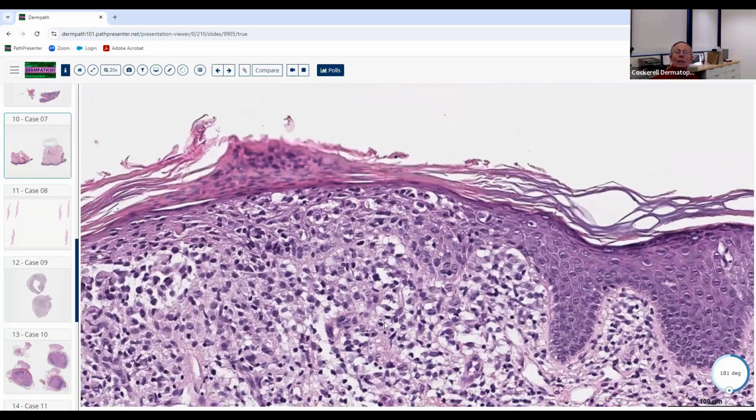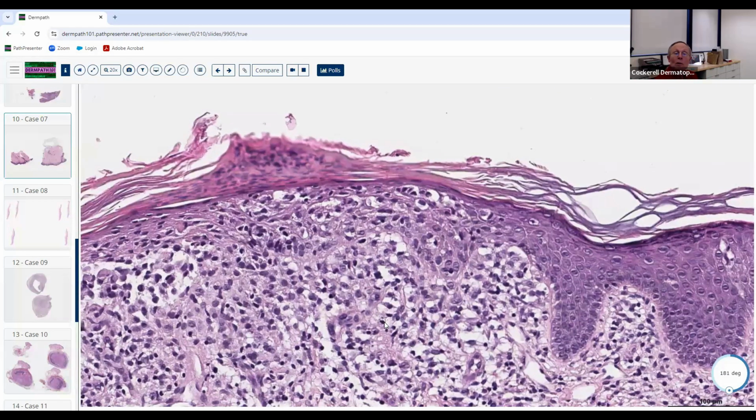And the other clue here that's a little different than the lichenoid granulomatous differential is that you've got the epidermotropism. Of that pattern, probably the closest would be granulomatous mycosis fungoides, which could give you this. But Langerhans cell histiocytosis commonly gives you epidermotropism. It's in the differential diagnosis of the pagetoid intraepidermal disorders: melanoma, MF, Merkel cell, sebaceous carcinoma, Bowen's squamous cell carcinoma in situ, Paget's. Those are the things you have to keep in mind when you see this intraepidermal pagetoid proliferation.